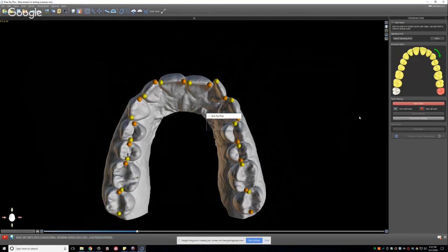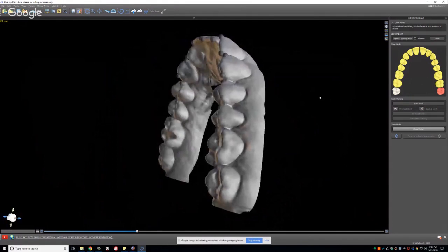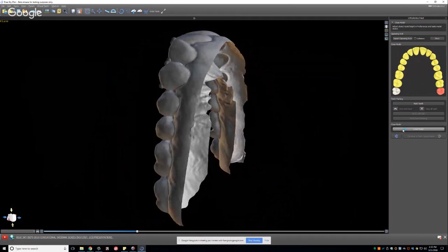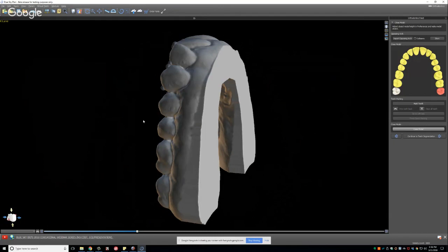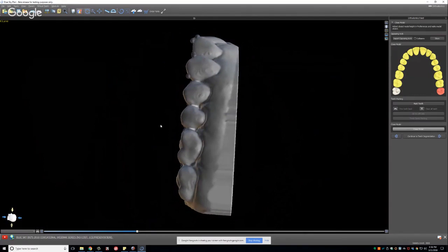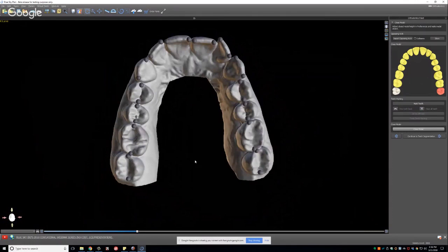So once we've finished marking, the model is open, as with most optical models. So we're going to close the model. Now, in some of my older videos, if you've watched my videos on YouTube, I used to base the models in Meshmixer and do all sorts of other things. I don't do that anymore. I found that the models generated directly from BlueSkyPlan are the best I've come up with. One of the nice things is they print predictably, but also the software moves the fastest.